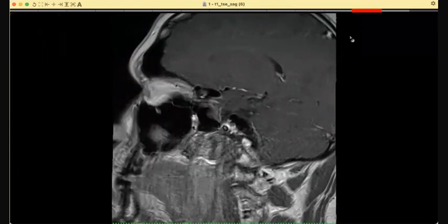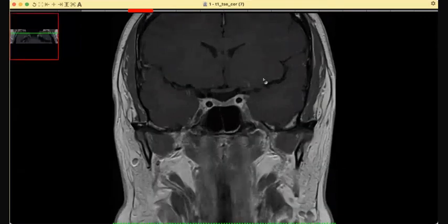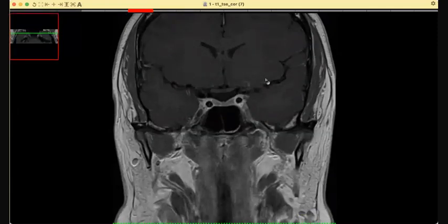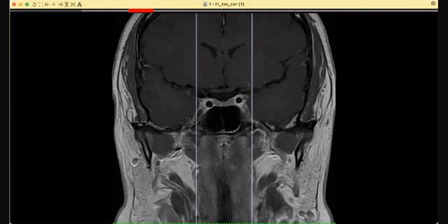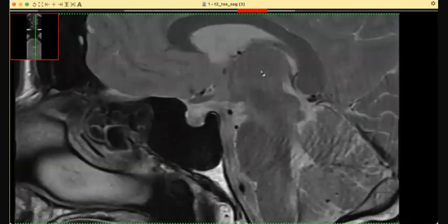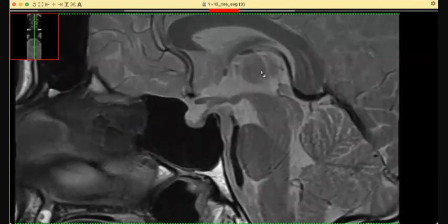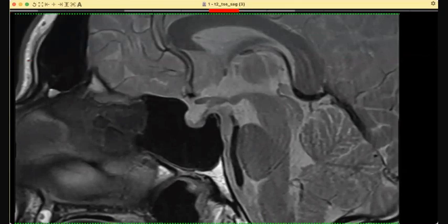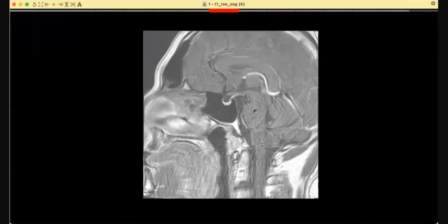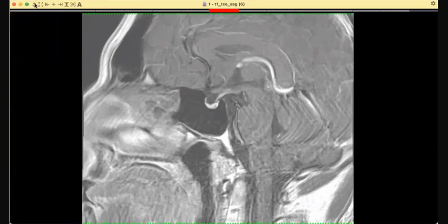Just one second, please. Or a Rathke's cleft cyst. Yes. I will show you. Just don't use your mouse. I'm using the mouse. This is the appearance on coronal, and because of time factor, I will also show you a T2 weighted sequence. Okay. I will again show you the post contrast. You are right that there is something there, but it is.